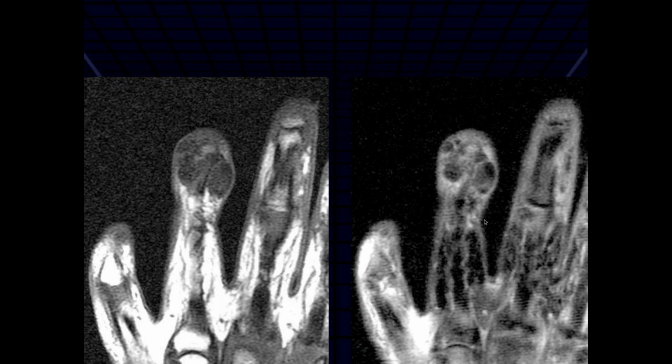So giant cell tumor of the tendon sheath would be high on the differential given location. Dermatomyositis, that's the other thing I think about. Often with dermatomyositis it's typically more in the skin, but you can get large calcified lesions, but it's primarily involving the skin. So this one you would include brown tumor as well?